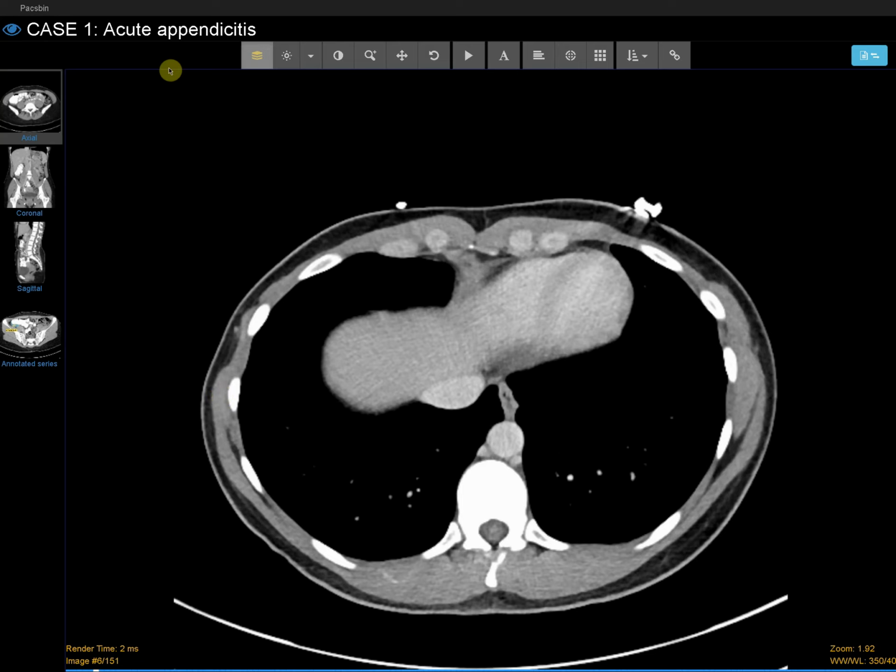Hi guys, in this video we're going to go through a case of acute appendicitis. This is a case from learnabdominal.com, a website made by Dr. Michael Hartung. I'll walk you through how I approach a case that I see in the emergency department. Some people like to follow their search pattern no matter what.